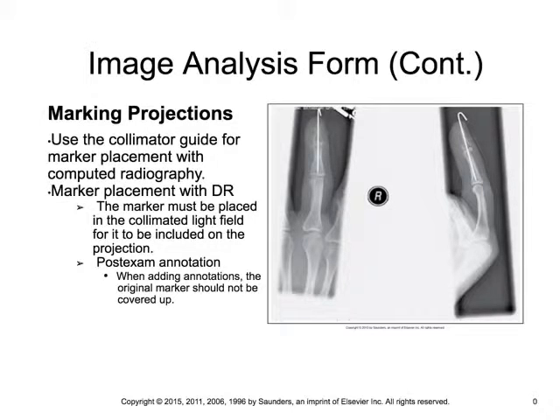If we're doing AP or PA projections of the torso, vertebra, or cranium, place the right or left marker lateral to the side being marked. Okay? For lateral projections of the torso, vertebra, cranium, etc., the marker placed on the image receptor will indicate the side of the patient's position closer to the IR. Right, so for example, for a left lateral chest x-ray, we want to make sure that that left lateral marker will be projected on the left side in relationship to the patient.